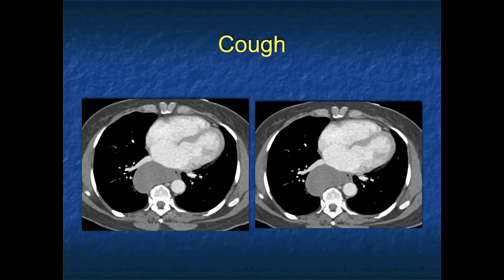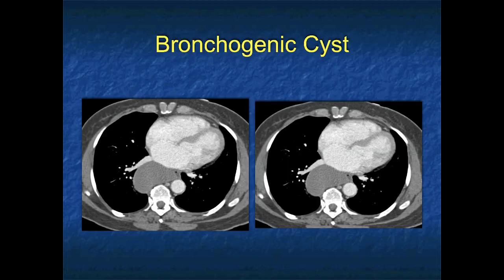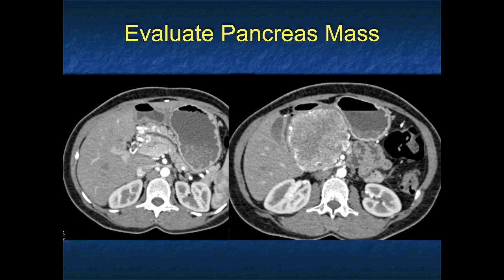And I come back with this case with a cough, again a cystic lesion, more posterior mediastinum, going to the middle, going up to the tracheal bifurcation, splaying that, water density, boom, bronchogenic cyst. Bronchogenic cysts are most common right paratracheal and subcarinal region. This was subcarinal, great example.